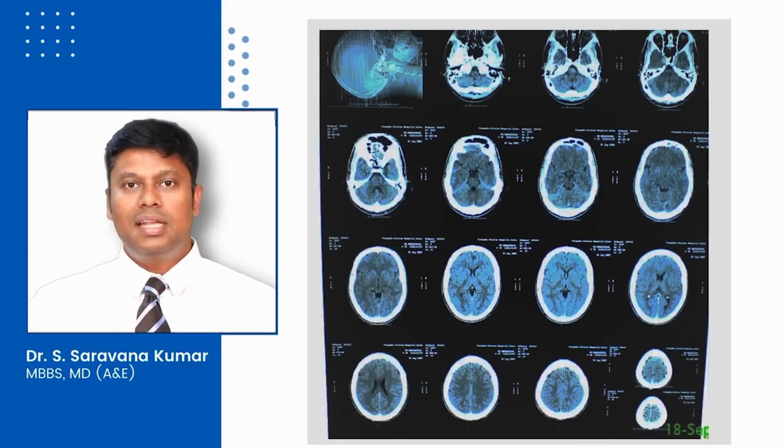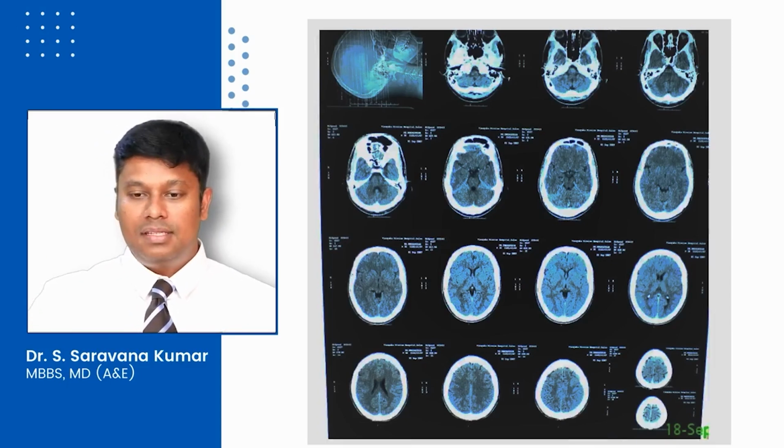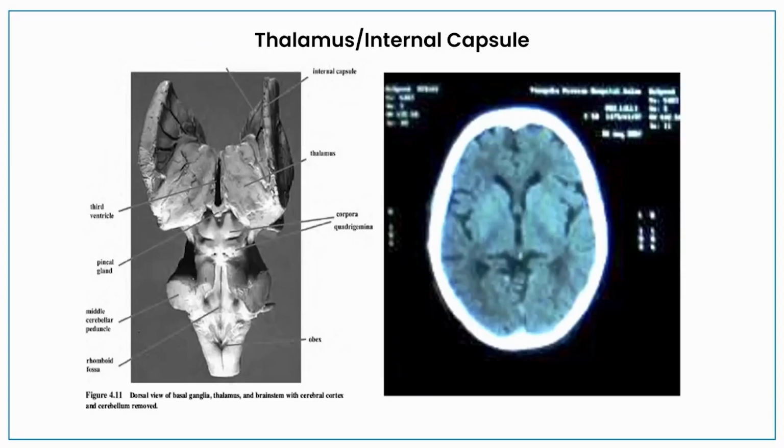You will usually see it after 3 or 4 images, and once you identify that, you can clearly understand that's pons, and any image before that is actually your medulla. Anything after that is going to be your midbrain. So that's easily how you identify midbrain, pons and medulla, right? So coming to the structures which are above them.